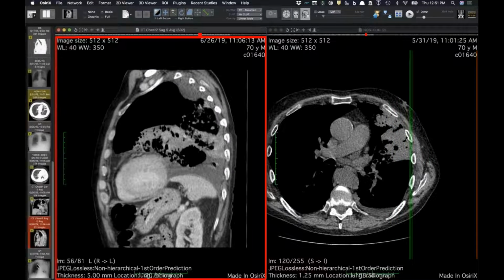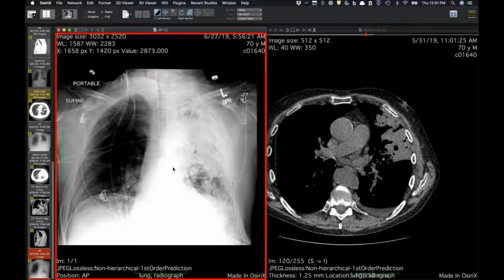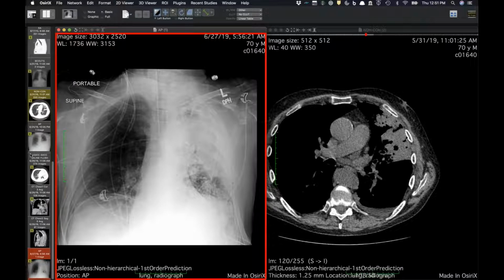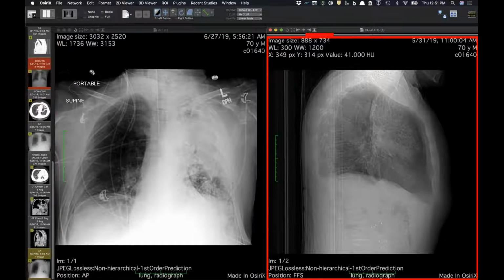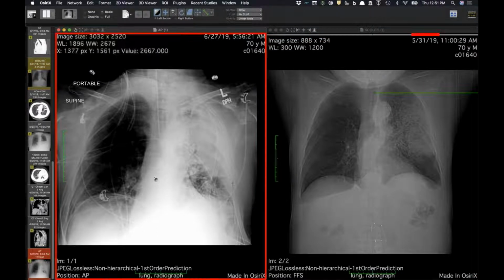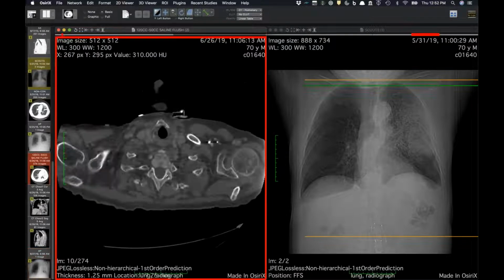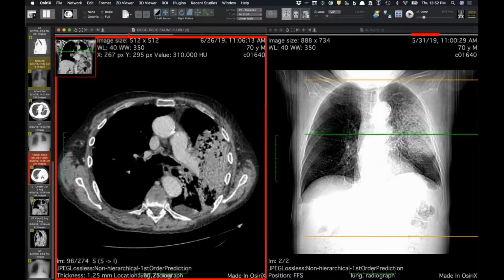What's interesting is that he was transferred to UCSF overnight and then operated on, and they detorsed him overnight. And you can see now that the pneumonia is back up in the left upper lobe as it was on the radiograph from a month ago. So it was only a partial or incomplete torsion. The vessels were still patent, so there wasn't complete ischemia or infarction of this lung.